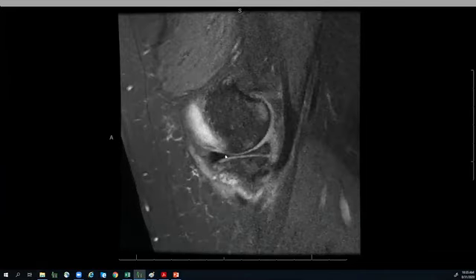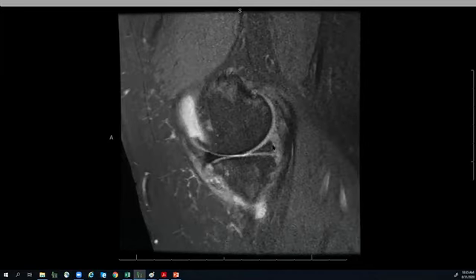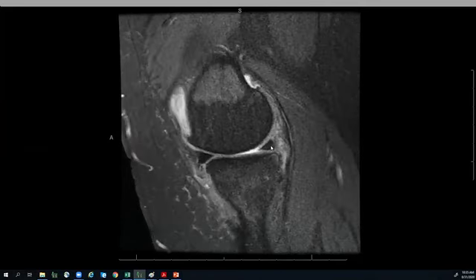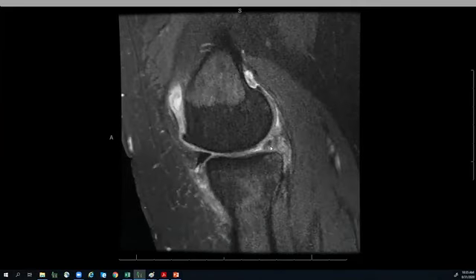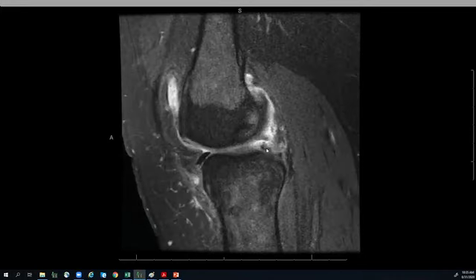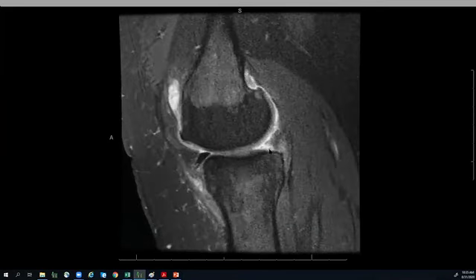So right here, we have our medial meniscus body. Here's the posterior horn of the medial meniscus. And as I start approaching the posterior root attachment, I'm going to see that this meniscus disappears for a slice, disappears for a second slice, and then I make out a small nubbin at the attachment of the posterior root. Basically, there were two slices where this meniscus disappeared. Also, as we've discussed on the previous case, that's referred to as the meniscal ghost sign.